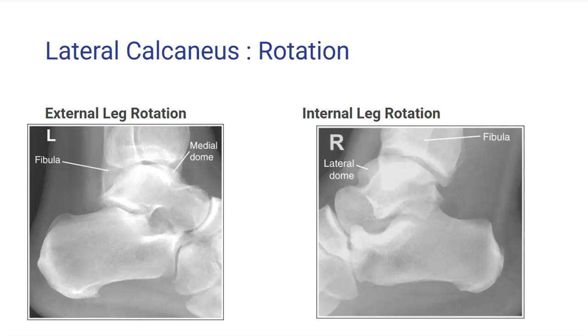If the leg is externally rotated beyond the appropriate positioning, where there is more pressure applied at the forefoot, the lateral talar dome will appear posterior to the medial talar dome. Additionally, the anterior fibula will be seen posterior to the mid-tibia on the image.